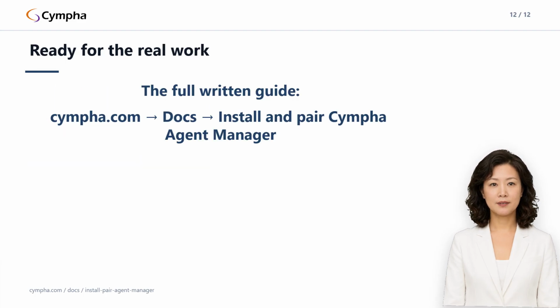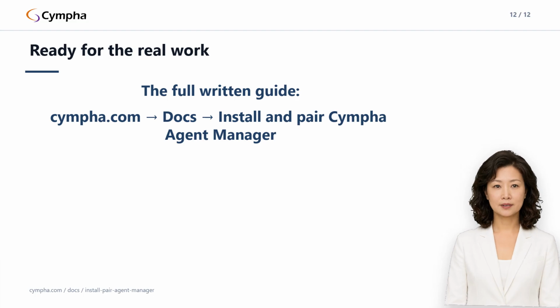The agent is installed, paired, and idling in your tray, which means every agent-powered workflow is now open to you. The natural next lecture is the one on Cloud Monitor and File Monitor, where this workstation starts pulling cases down and watching your scanner folder. If you're setting up a lab for AlignerBot, the lab setup lecture puts this piece in its larger context. And one dependency worth repeating from the written guide: the agent only has cases to pick up once your lab's AlignerBot service is enabled. The lab onboarding guide covers that side.